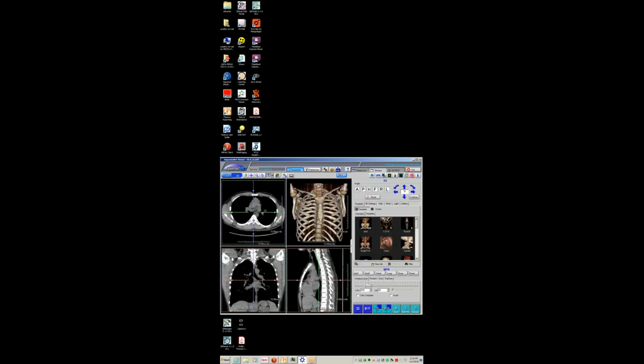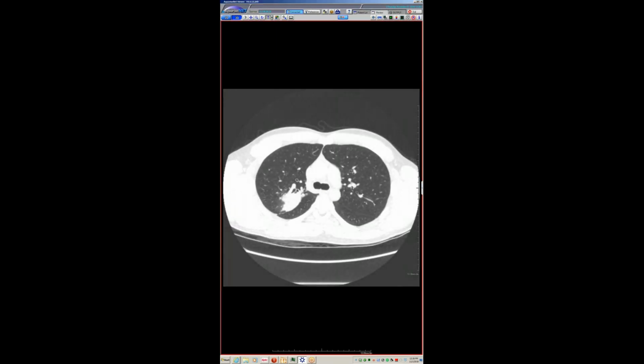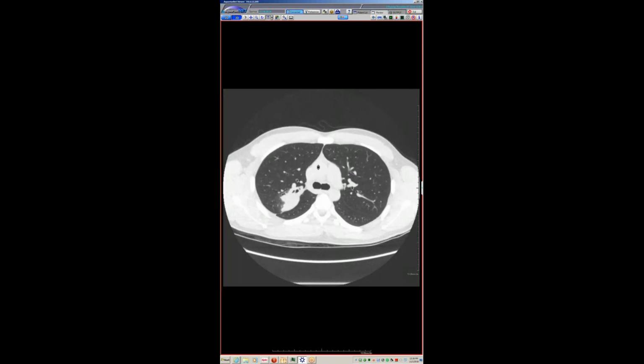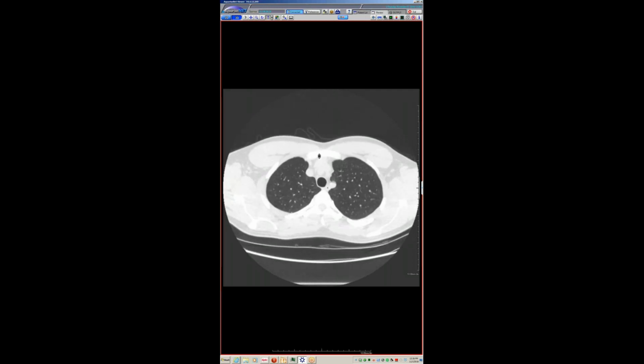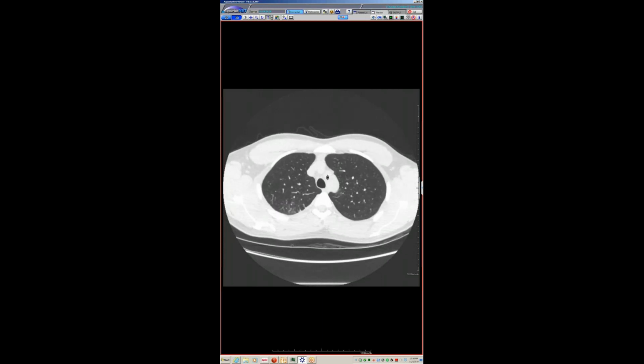And this one is interesting because we've all seen this before, but I've not seen it. This is something I always say, when I talk about it, should occur in the lower lobes, at least most of the time. Although this is kind of in an aspiration location, so this is a young kid, I think he's 16 or 18. Here you can make out some nodularity on the non-dependent portion of the trachea.